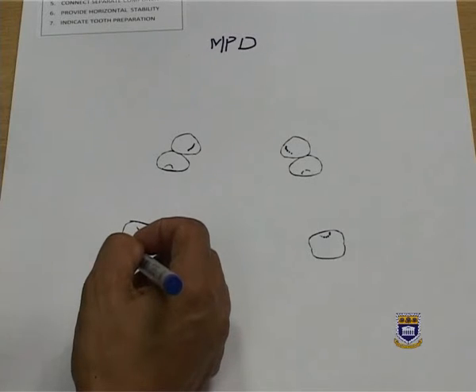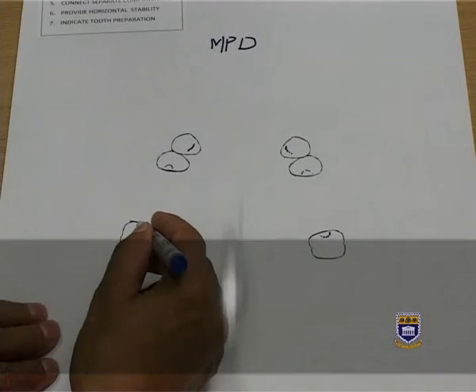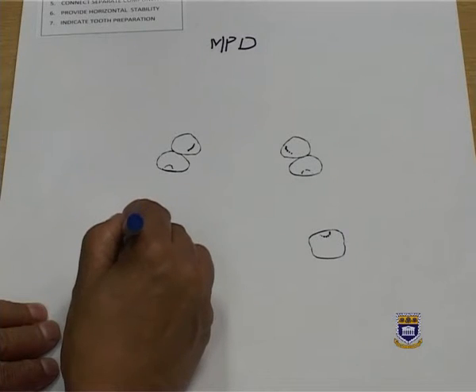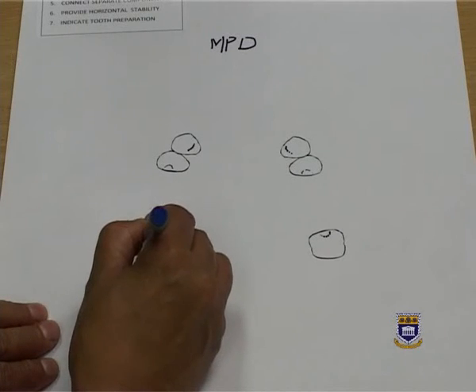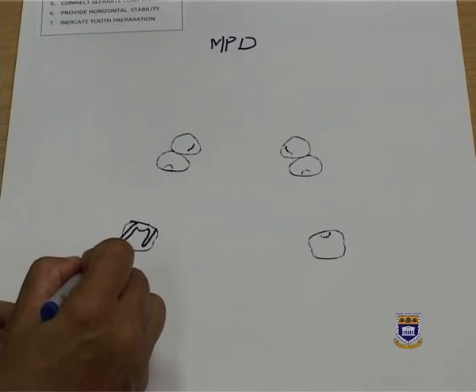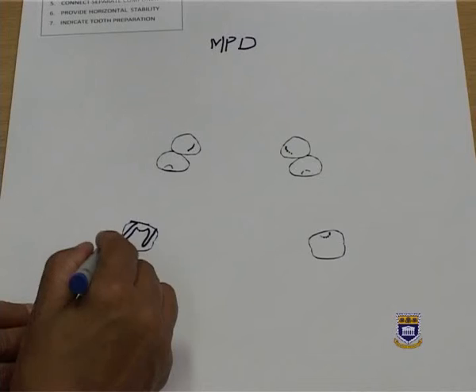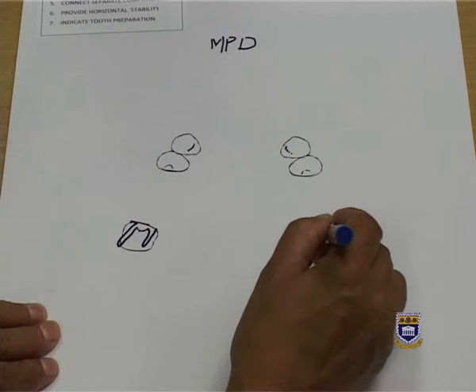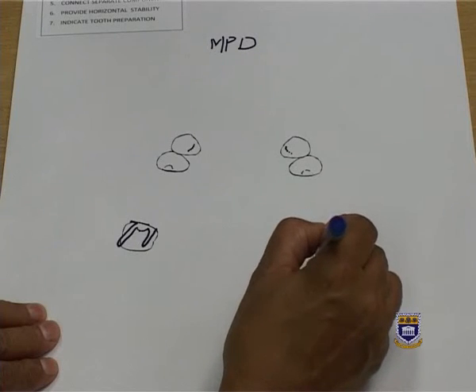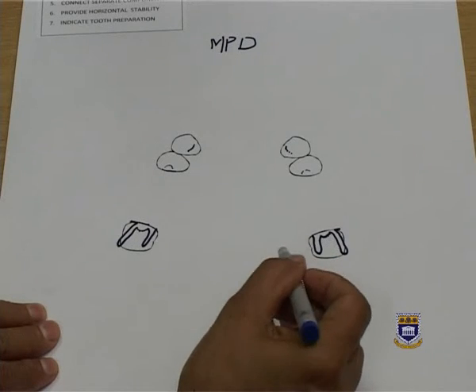So the next step is to provide retention. In this case, I'm going to choose to use circumferential clasps on both of the molars. A circumferential clasp has 3 components. It has an active or direct arm that engages the undercut, a reciprocal arm that reciprocates the action of this arm, as well as a rest. I'm using the distobuccal undercut on both of these molars. So the circumferential clasp has its own reciprocation.